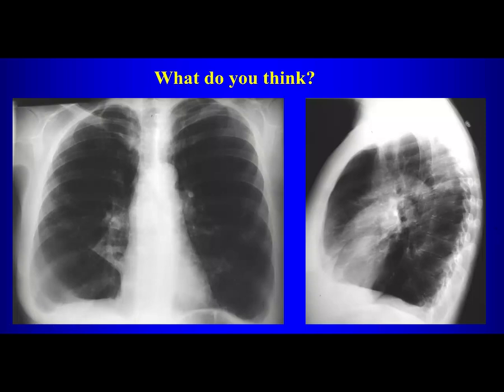So what do we think of the lung volumes? Increased. They're markedly increased, right? So this patient has hyperinflation and marked increase in lung volumes, okay? So if I told you the patient was a smoker, you would say what? COPD, emphysema, okay? But can we take this case a little bit further?